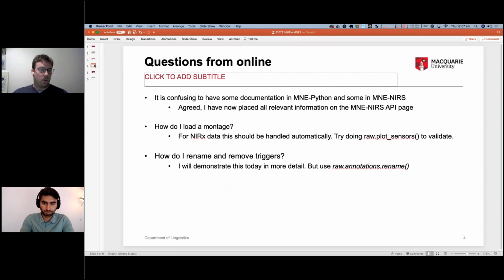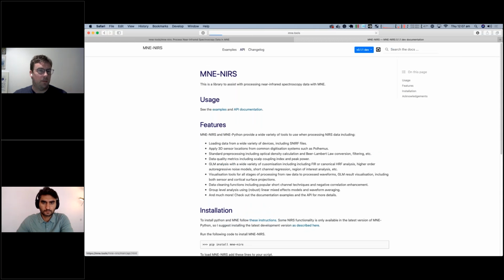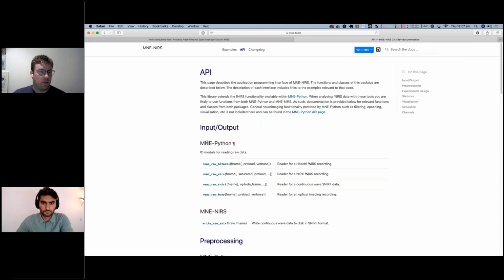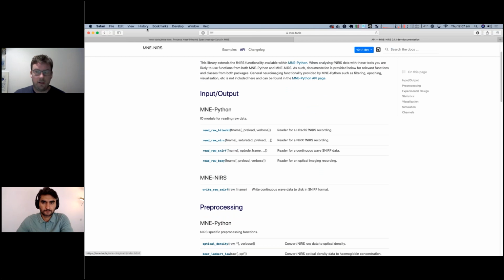I also got some questions and some feedback online from the previous talk. One person said it was confusing to have two sets of documentation. So what I've done is I've updated the MNE NIRS website based on your feedback. This is the MNE NIRS website. If you click on API, I've now included all of the functions from both MNE Python and MNE NIRS together. So hopefully that will make it easier. Thanks for the feedback.